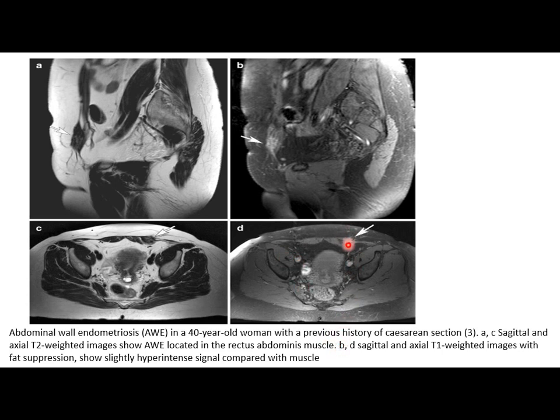So you can see it's a little bit hyperintense. The thing is here you have to ask the patient, does it hurt more during menstruation or not? Usually endometriosis becomes bigger and swollen and hurts more during the menstrual cycle.